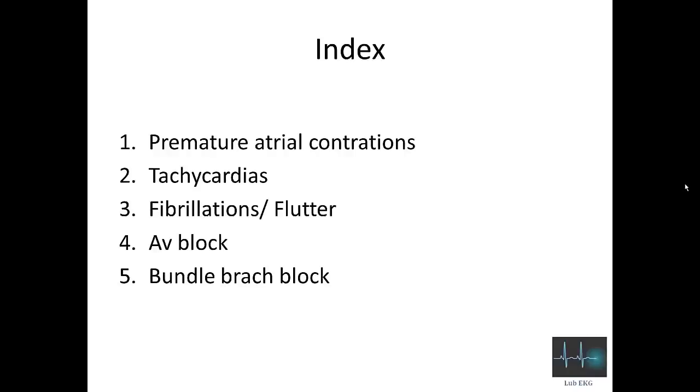I will start with premature atrial contractions, which is actually the most common arrhythmia. We'll also cover tachycardias, fibrillations, flutter, atrioventricular blocks, and lastly I will talk about bundle branch blocks.